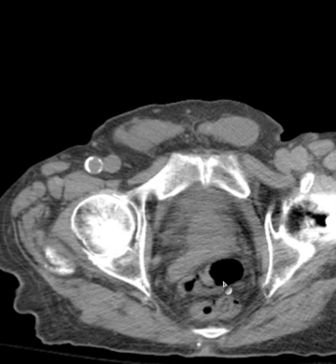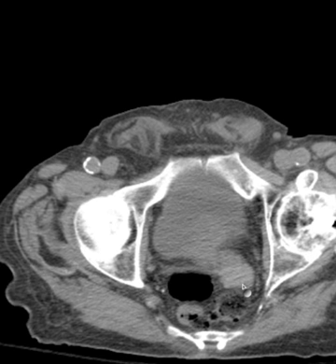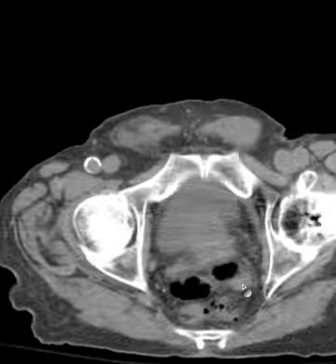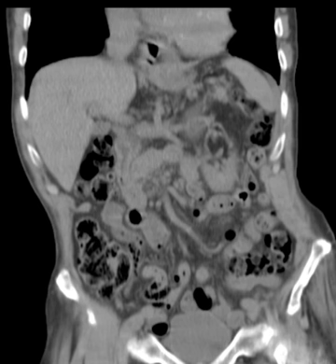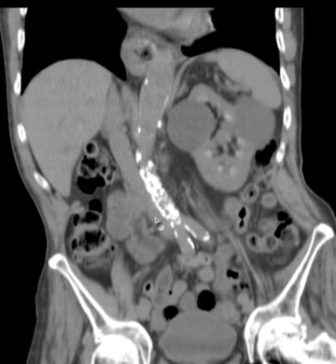So what is the structure? The structure, first of all, is seminal vesicle, and the seminal vesicle connects with the prostate on each side like this, and so does the one on the left that's larger. So I want you to know this anatomy. I want you to be able to look at a case like this and say, okay, this is the prostate. The prostate is big or it's not big, and then on a coronal image you can often see how it's actually impressing on the inferior aspect of the urinary bladder or not.